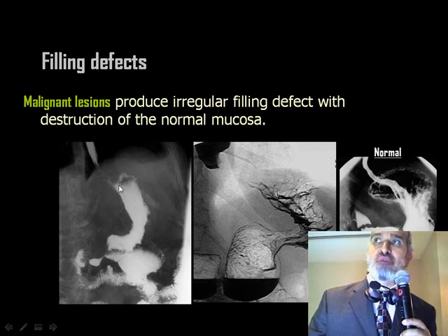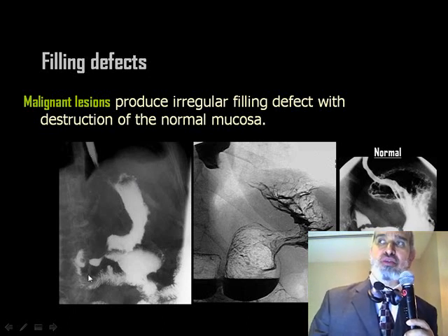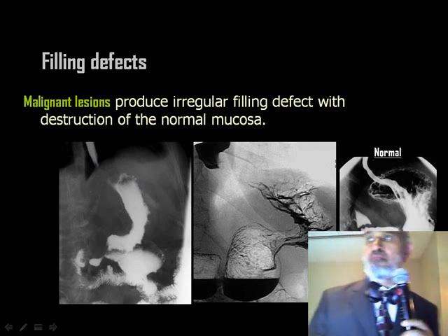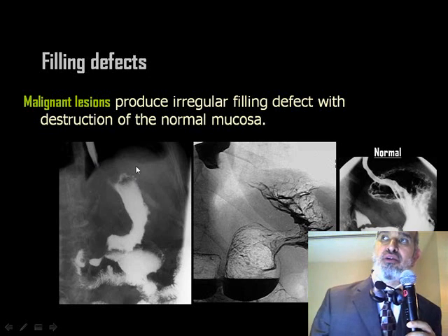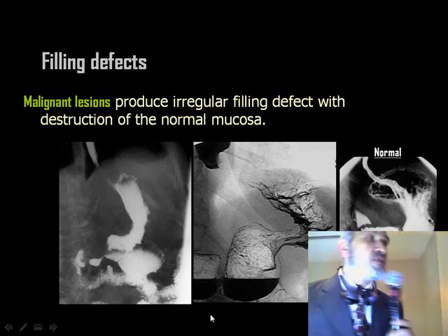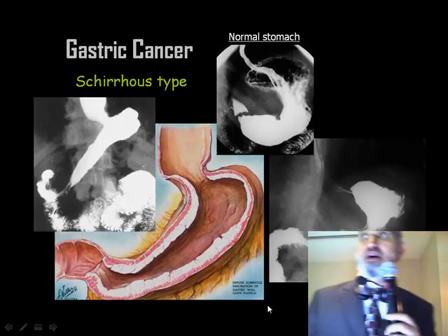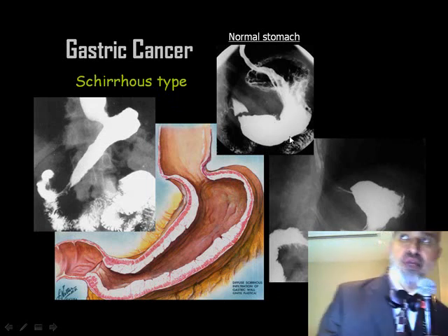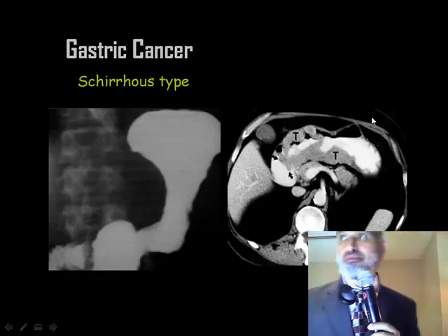Once the patient takes barium, barium passes immediately through the stomach into the duodenum and the jejunum. And you know that this is known as linitis plastica, or the scirrhous carcinoma of the stomach. And this is the drawing of the scirrhous carcinoma of the stomach, an example with barium, another example with barium, and this is the normal gastric appearance by barium.